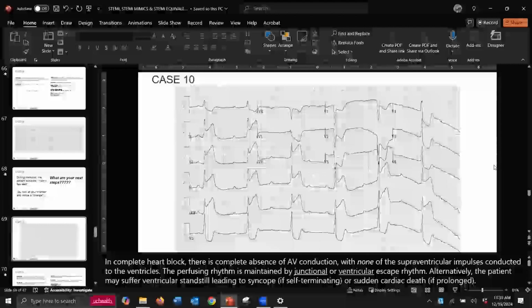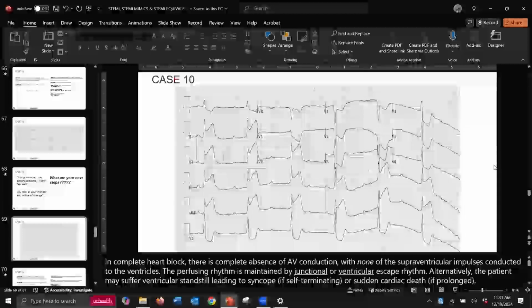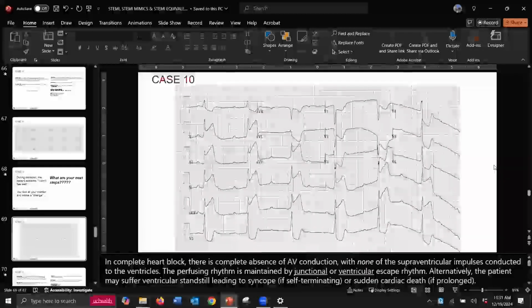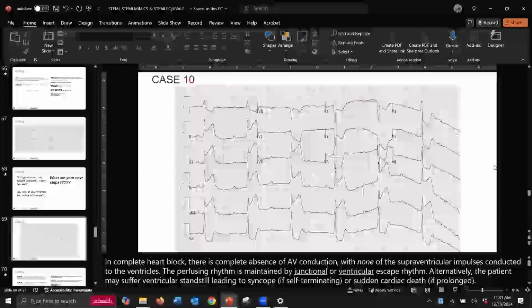When she says, I don't feel well, you hear this. How about atropine in this? No. Why not? What is this rhythm? Looks like either a second degree type 1 or a third degree. I'm going with a third degree. I just don't think there are dropped QRSs in this. I was going to say, where's your block? Third degree. Why do you say third degree?